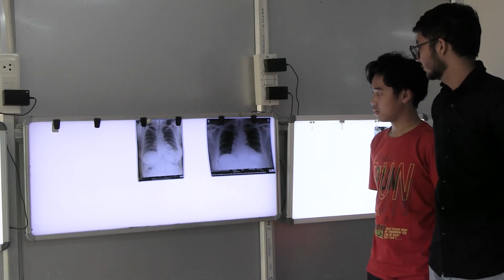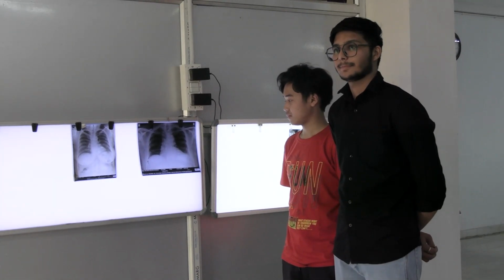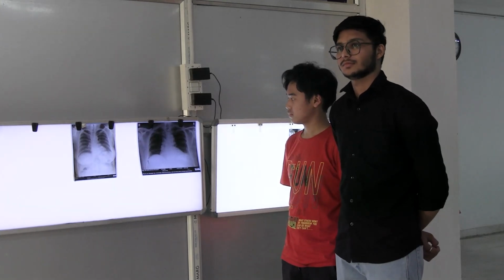How do you know that's the left side? Mark there, left side. All right. So identify the easy way to identify the right border half and the left border half. Okay.